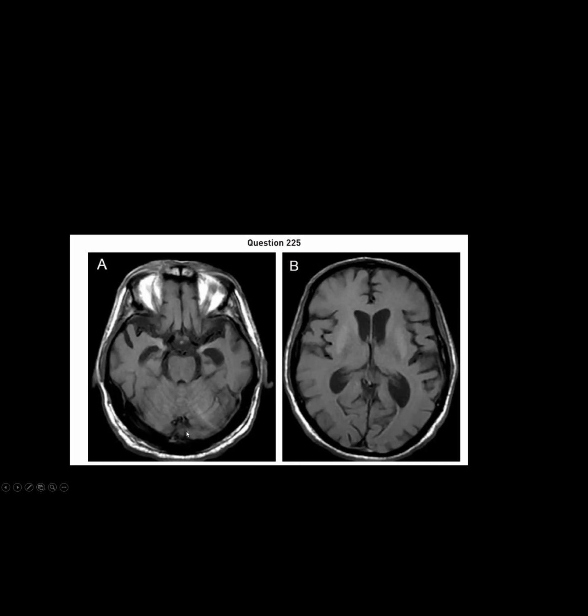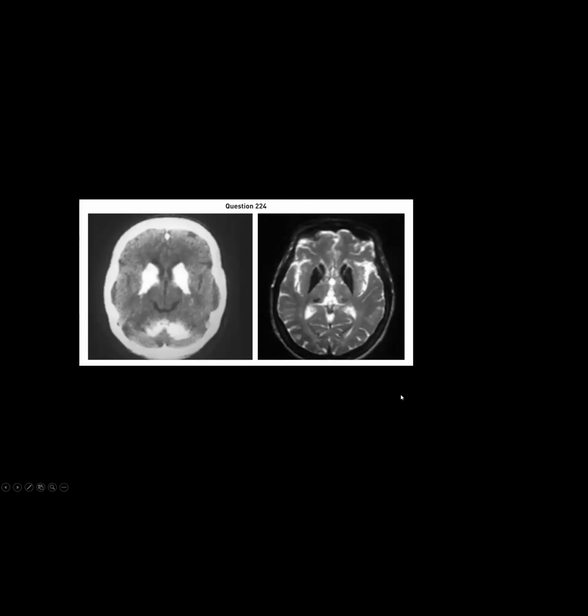Another example of the same thing. I'm not sure of the diagnosis here, but if you look, there's bright signal in the basal ganglia on both sides. I would think of this same differential if you see that, then narrow it down based on the question stem.